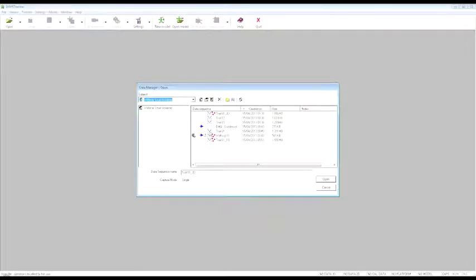In addition to that, we can have other icons. So for example, the icon related to the EMG signals. That means that inside this file, we have also information about the electrical activity of the muscles. Or we can have, for example, the movie icon that is to signal that we have also a video recording linked to this trial.